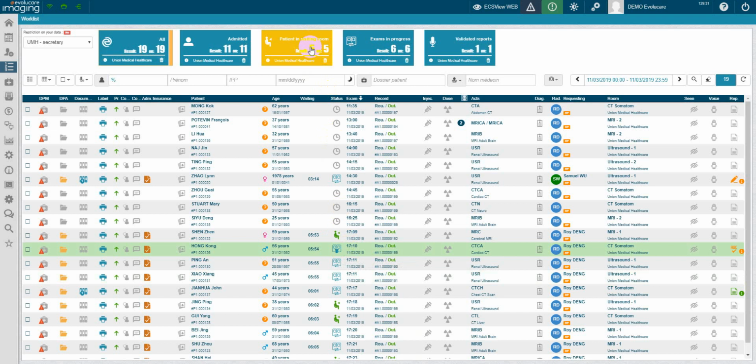And actually I can define different levels of alerts. For instance, starting at 10 patients in the waiting room, this widget might become red. This way I can have a visual overview of how my service currently stands.